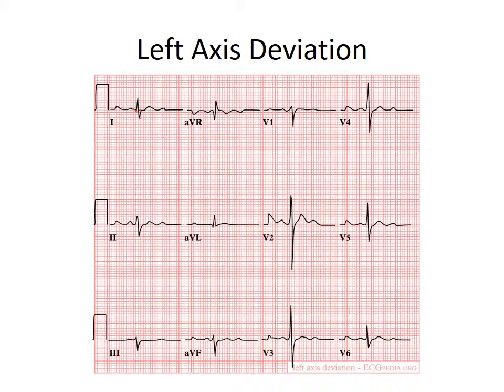So now let's look at AVF. AVF, what is it? Mostly negative. There's very little above that baseline. Most of it's negative. So, this is a left axis deviation.